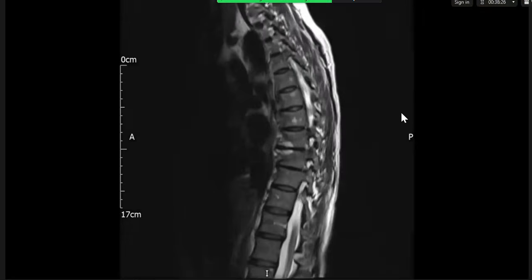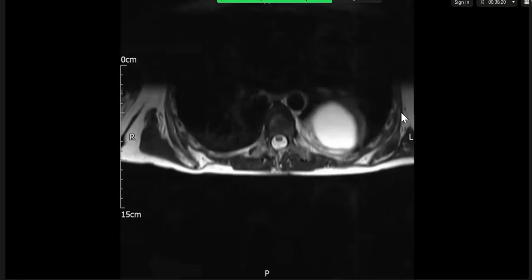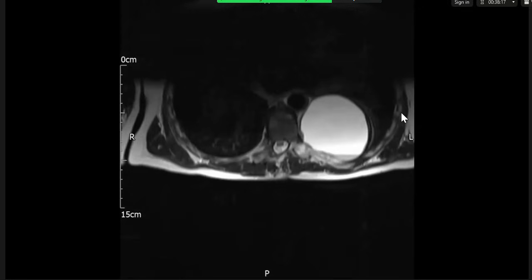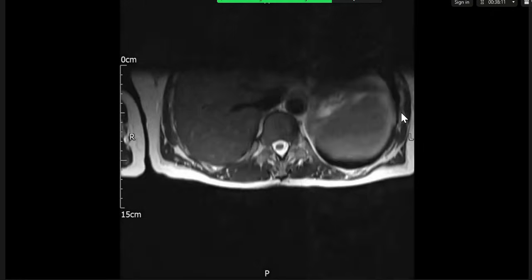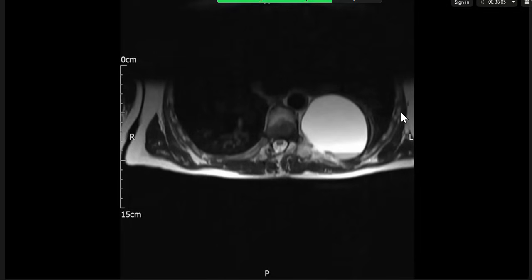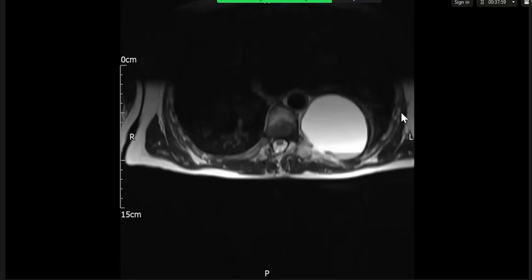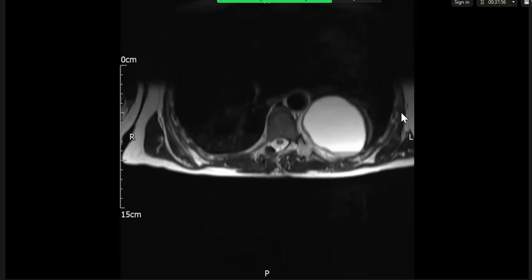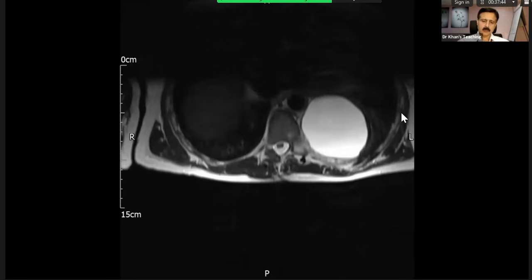That's an axial T2 weighted sequence, which shows that same lesion. I can add to the previous finding that there appears to be a fluid level within the lesion, implying some differential contents. I can see the focal rib destruction here. The normal dark sclerotic cortical border is lost. Yeah, please continue. There are more. Okay.